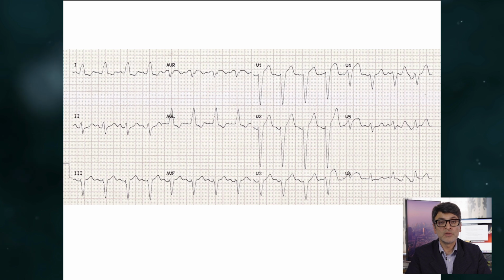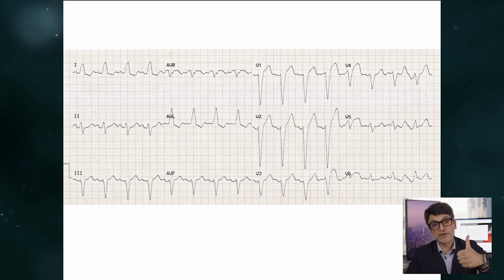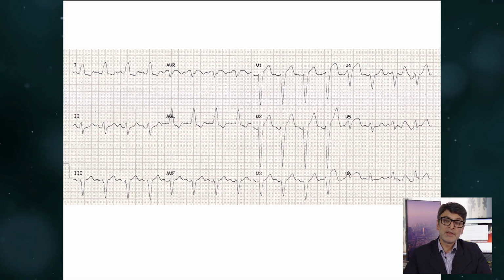You can't ignore any of these bundle branch blocks, but the take-home message is left bundle branch block is far worse and requires specialist evaluation. Right bundle branch block is still a concern, but those concerns can be largely allayed by having an echocardiogram performed in the community that shows a structurally normal heart. So very simply, left bundle branch block, it's a thumbs down. It's bad news. Right bundle branch block is a relative thumbs up. And that thumbs down, thumbs up way of looking at it is critical to unlocking how to differentiate left bundle and right bundle branch block.